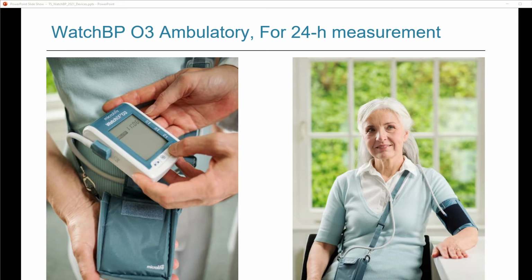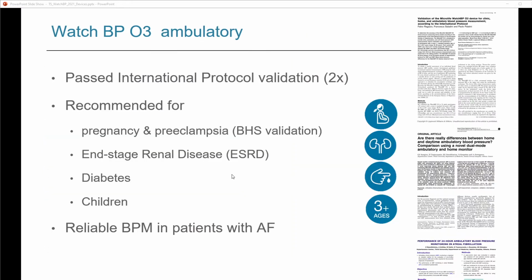And in this video, I'm going to explain to you the WatchBP 03 ambulatory, which is the 24-hour blood pressure monitor from MicroLife, the one that you can see in the picture here.